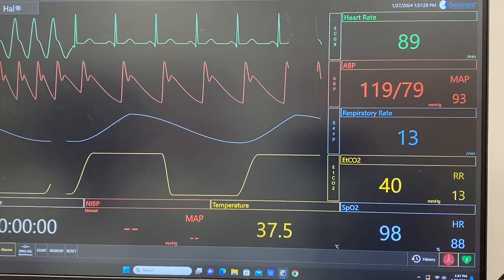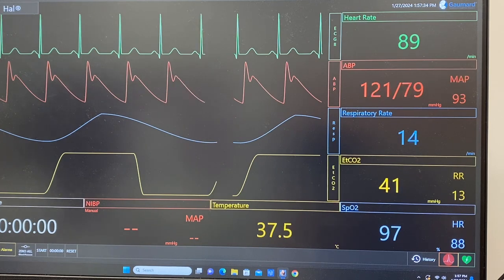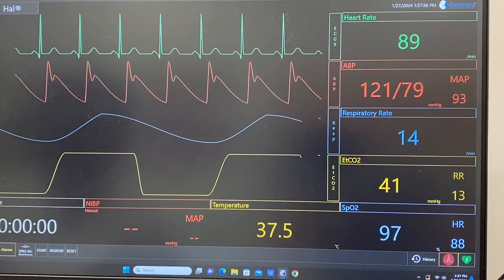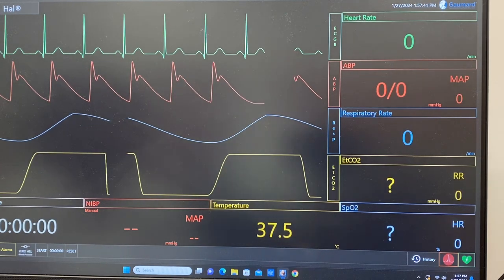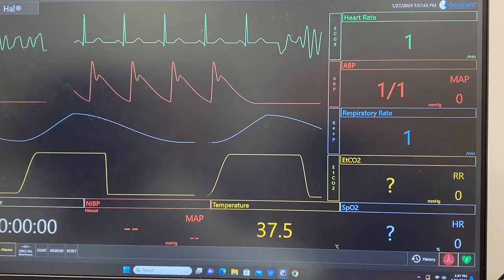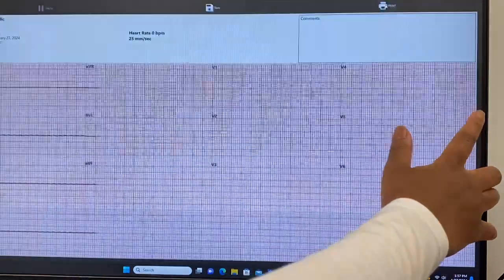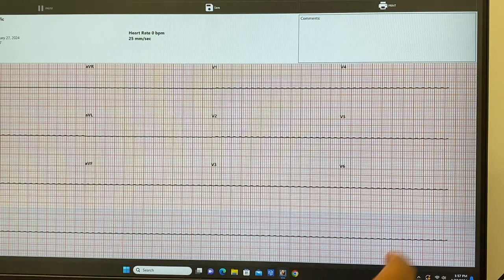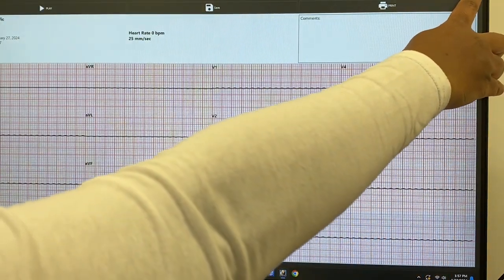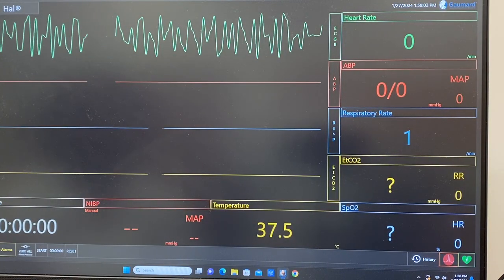Okay, that doesn't count, Ami. I'm going to give you another one. Okay, here we go. Yeah, that's not cooperating for some reason. So X that out. You're just going to have to look at the telly. Okay. And there's your telly. Oh wow. Tell me what you see.